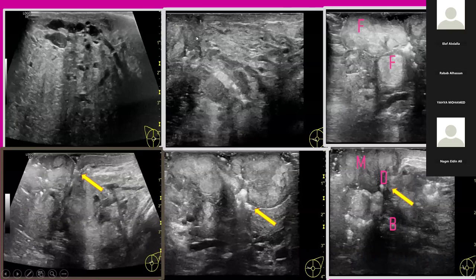And when we trace, we could see also two convergences. As you know, the normal ductal convergence from the whole breast radiates toward the nipple. But in this patient, I could appreciate I have two ductal convergences.